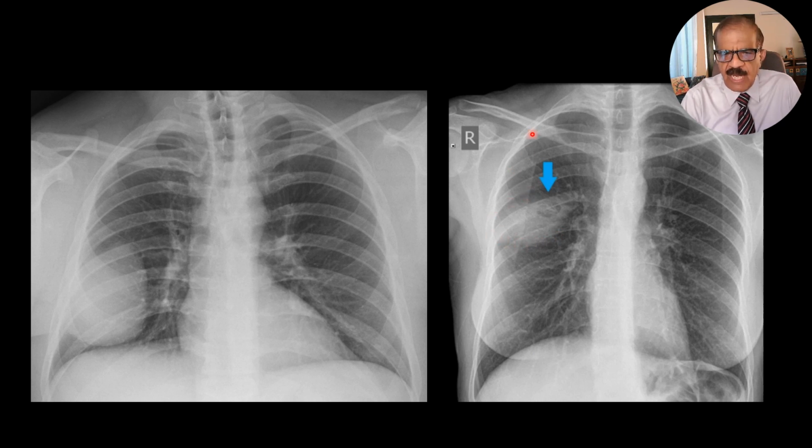And if you know the anatomy, I think in the first X-ray I showed you the anatomy. Maybe I'm going to show you later. So this is the path of the oblique fissure, and this is the transverse fissure. In the middle is the middle lobe. So in the transverse fissure, maybe there is encysted effusion. I'm going to show you another, more common type of encysted effusion.